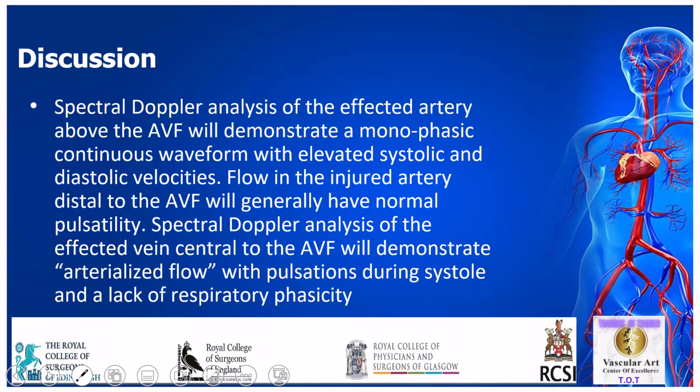Always use three things, as we have mentioned. You need to have the B mode image, and you must have the color, and you must have the spectral Doppler. When you get these three elements, then you can have information about these tissues.